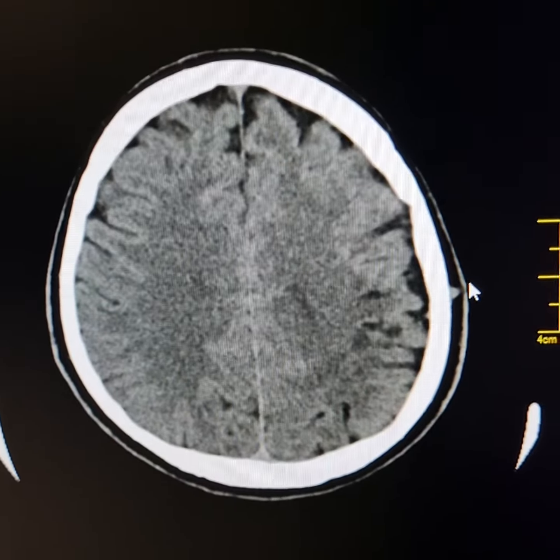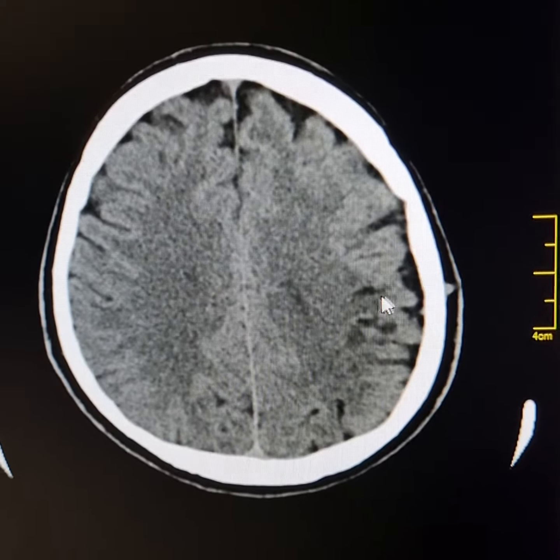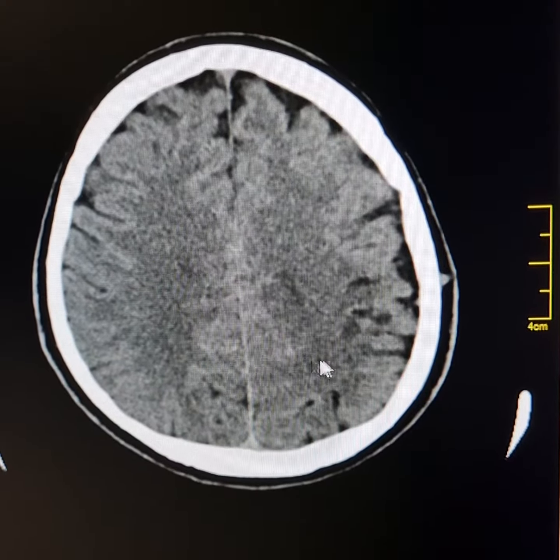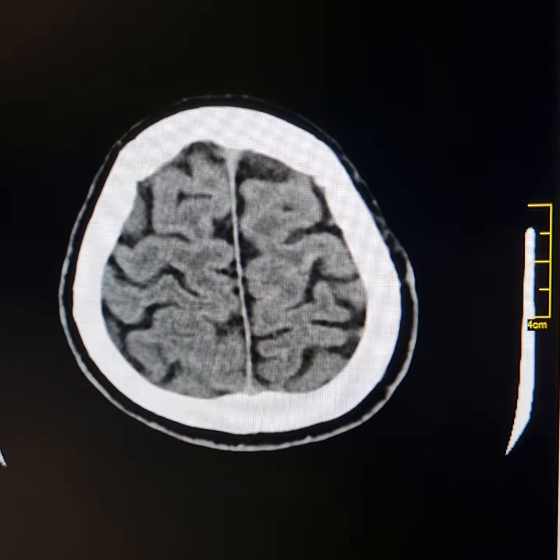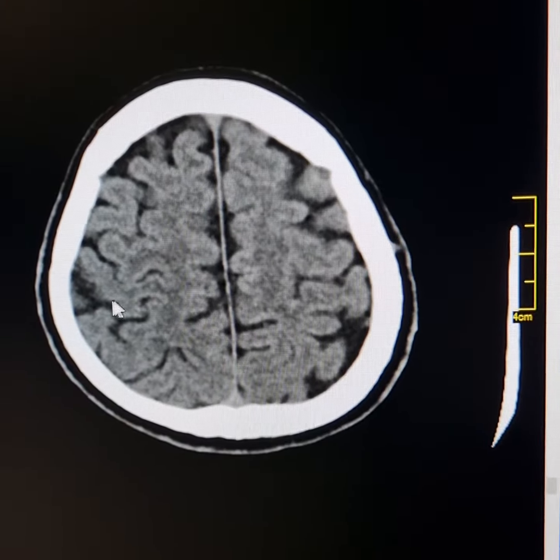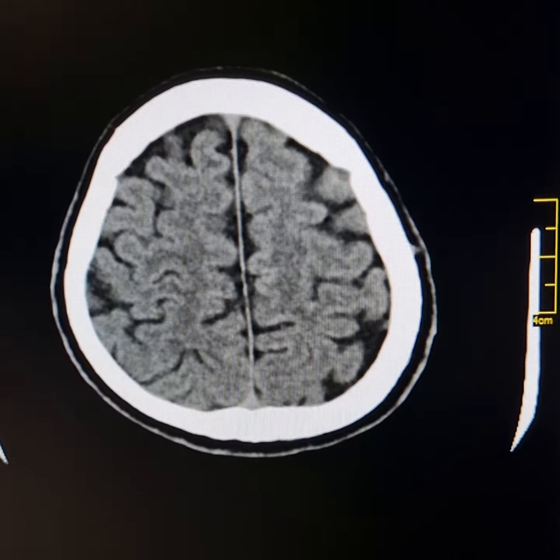Now just see that left hemicranium is relatively smaller in size. Just see the bone thickness. This is relatively thicker, while this parietal bone here, it is relatively thinner. And this difference, you see, this is thickened, while this part of the parietal bone is relatively thinner.